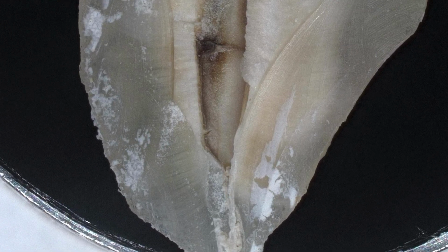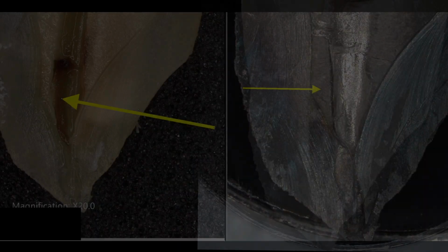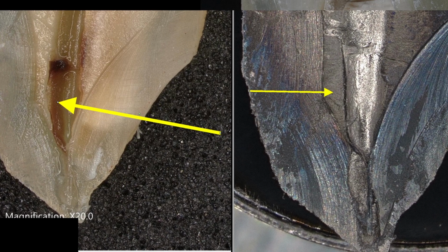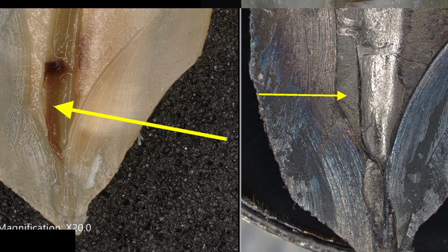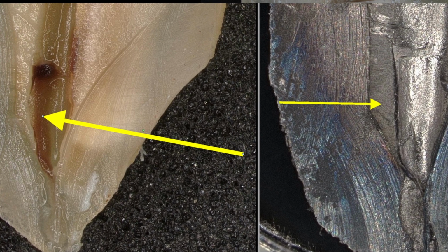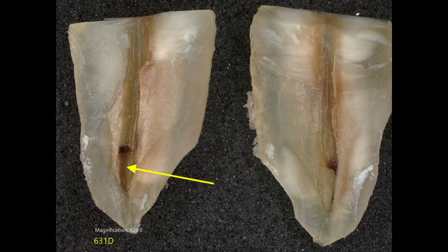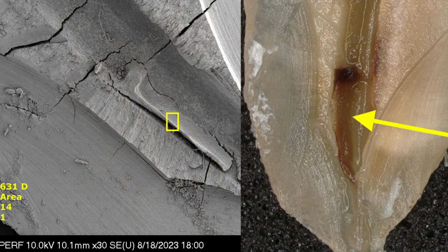As you look at the fully dehydrated specimen, it becomes even harder to identify the stump, and the sputter-coated view increases that difficulty even more. In the comparative view, spend some time getting your bearings. You'll notice the bright, shiny surface is the instrumented surface, and the dull area where the pointer is, is the pulpal stump. So we were looking at the left half of the specimen and going to image the pulpal stump. Try and correlate the SEM view with the wet specimen view to get your bearings.